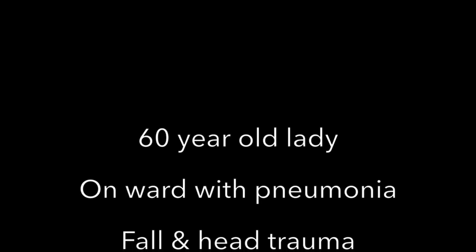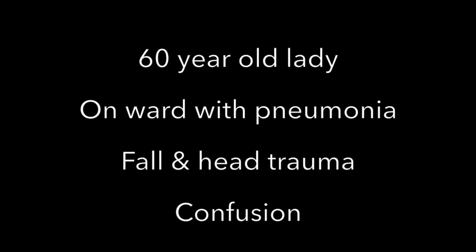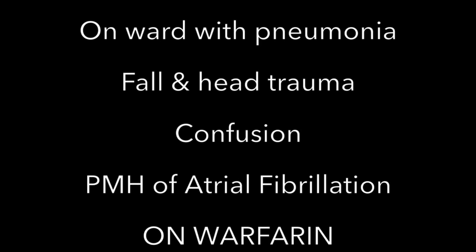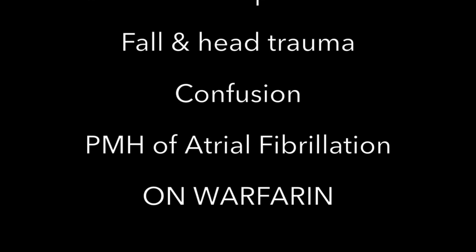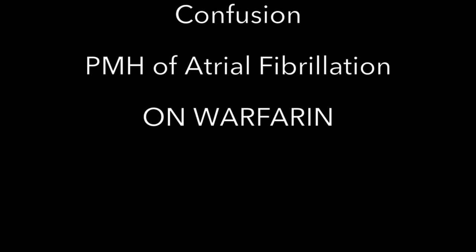Here we have a 60-year-old lady who was an inpatient on the ward because of pneumonia. One night she got out of bed to go to the toilet, but unfortunately fell and banged her head on the base of the bed. The nurses found her on the floor. She was confused. The extra worry in this patient was she was currently taking warfarin for atrial fibrillation. In view of these findings, a CT head was requested.